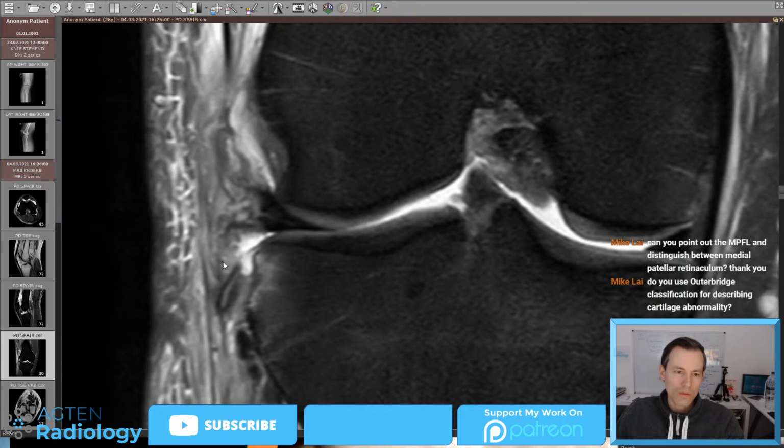Why is it not fully torn? I would argue if you have the avulsion of the ALL, the bone was weaker than the ligament, so we have the avulsion, and we should not have a complete tear of the ligament, although maybe it's also completely torn. Who knows? But just logically, either the ligament or the bone is weaker and tears or gets avulsed. But I think it doesn't really matter as long as we point out an injury of the ALL in this patient.